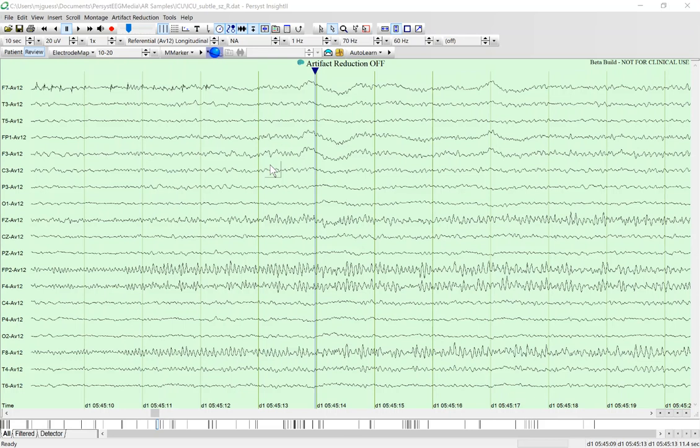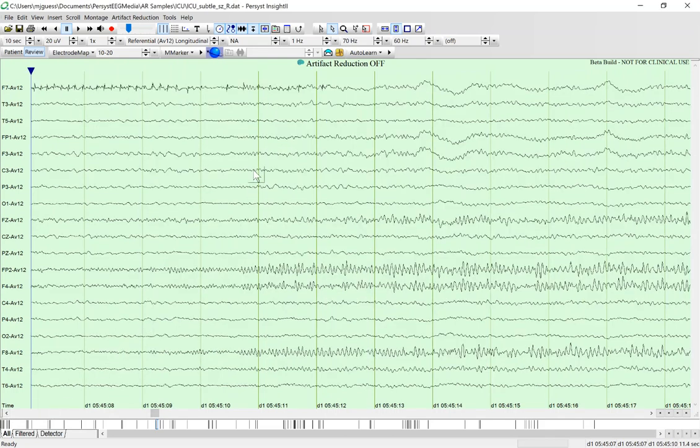This is just a quick ad hoc screencast on how to extract information from the vertical adornments in Insight 2. I've gone ahead and moved up to a page of EEG with the onset of a seizure. And so the first thing I want to do is define what I want to measure.